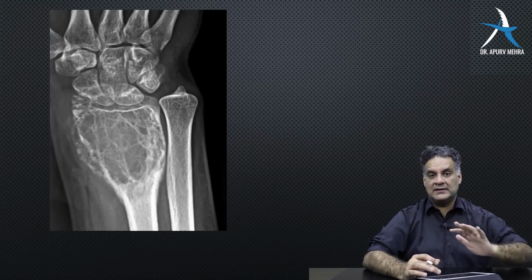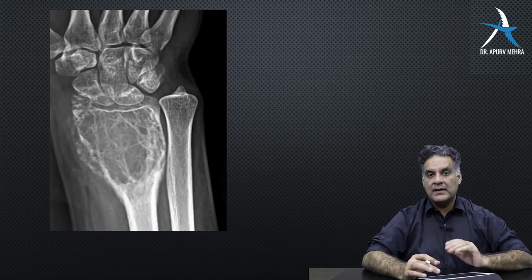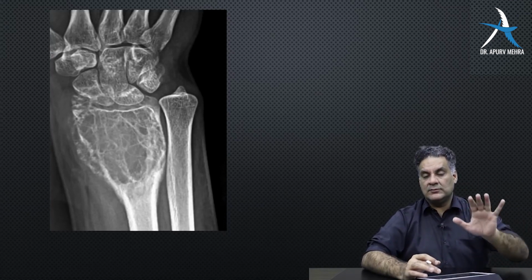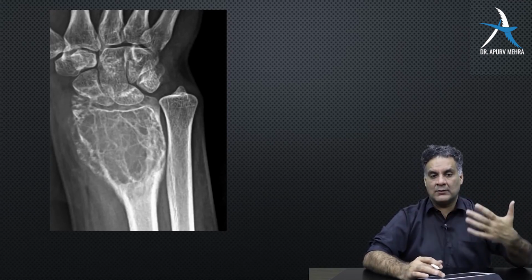And this is the only tumor that can go till the joint, the giant cell tumor, most commonly seen in the lower end femur, but classically seen in the lower end radius. In fact, a tumor of the lower end radius is GCT till proved otherwise.